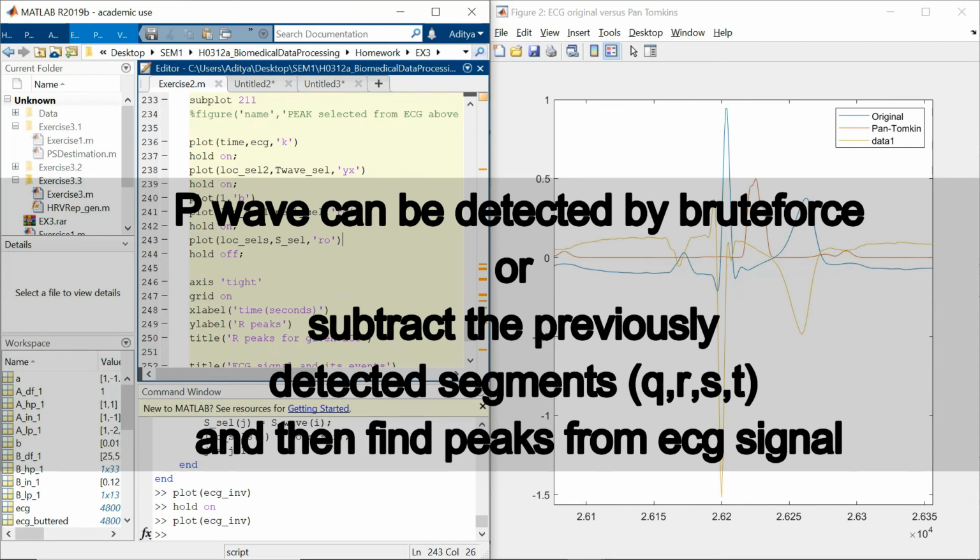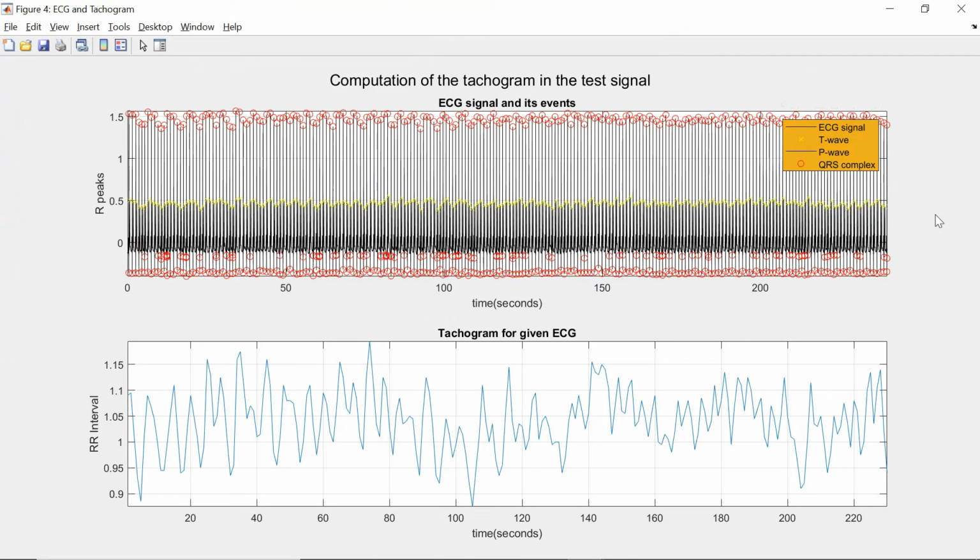This looks a little complicated, but you will find that all your points are properly indicated, and you can look in one particular segment of it in order to be clear.